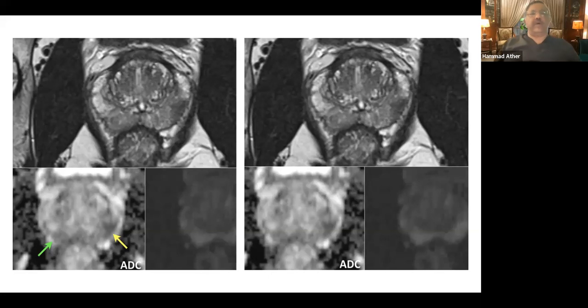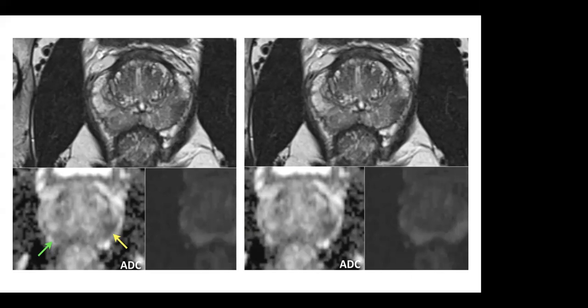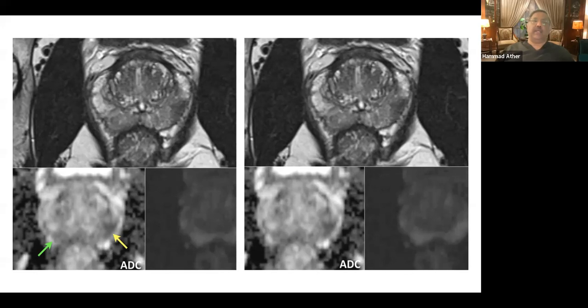So, Dr. Basit, if I have understood correctly, the lesions which have a particular shape, like this wedge shape, with clear margins, shown on the ADC map but not on the diffusion weighted images, are less likely to be a carcinoma. It's more likely to be an inflammatory lesion or prostatitis, right?